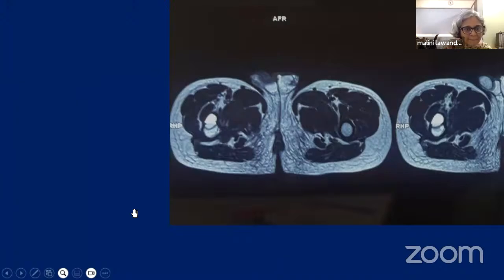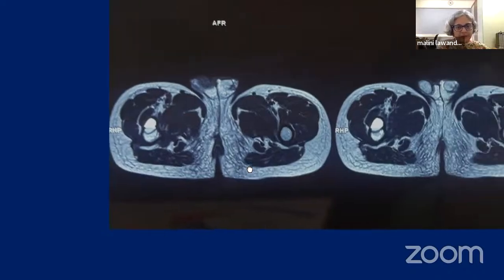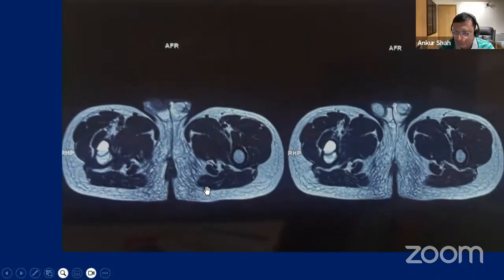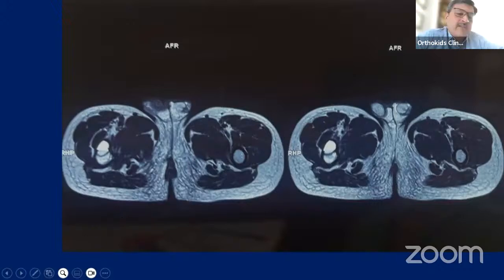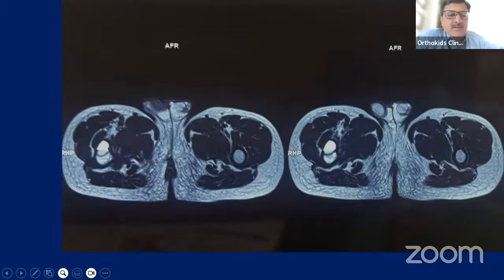Maulin, do we have contrast enhanced images here? Do we have contrast images? There's a fluid level for sure. Tashfin, do we have any? Have you put any other image? No, sir. Well, Tashfin thought you all are so smart to find out from this image.